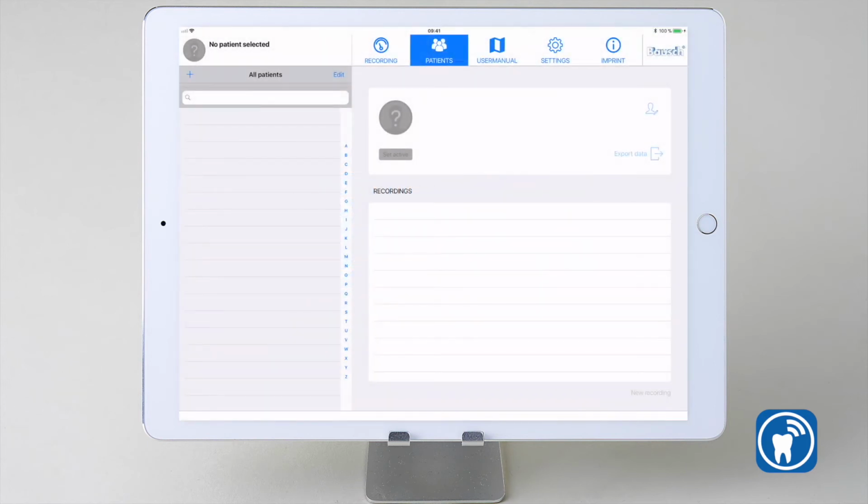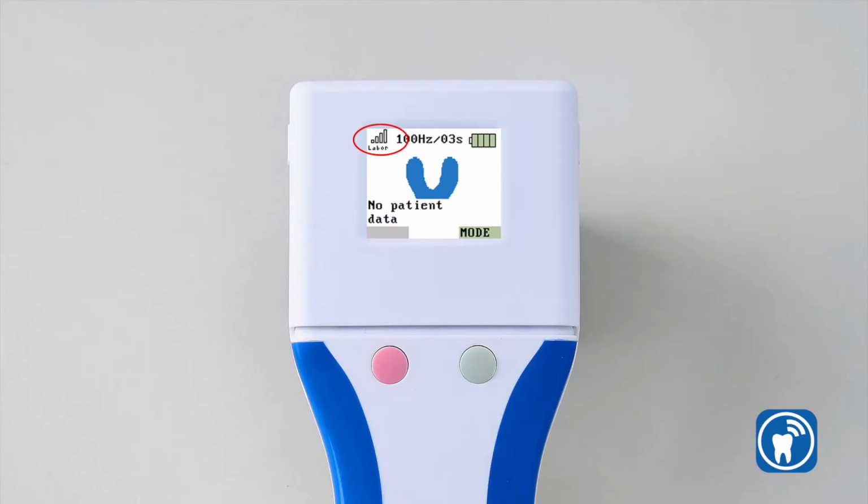If the connection between the handheld and the wireless network has failed, the connection status is indicated on the handheld screen by transparent status bars. In this case, you have to reset the handheld to factory default before you transfer the wireless network data again.